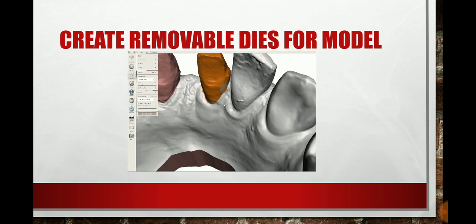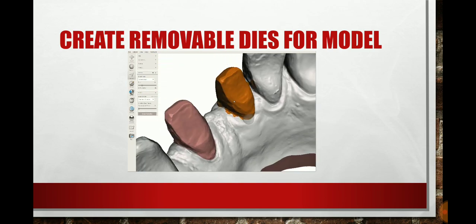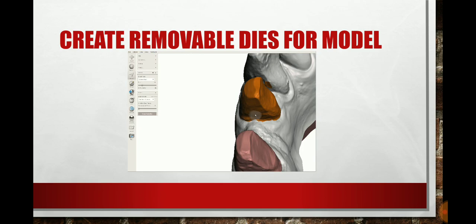Here we're cleaning it up again, going in, using your right mouse click button and your control, and then we're just going around this as if anything else that we would do, just cleaning it up and actually creating that actual die.